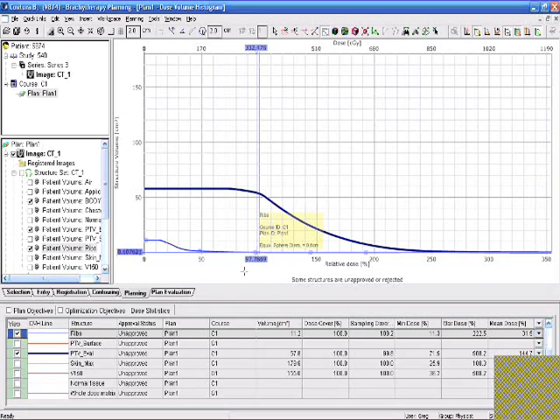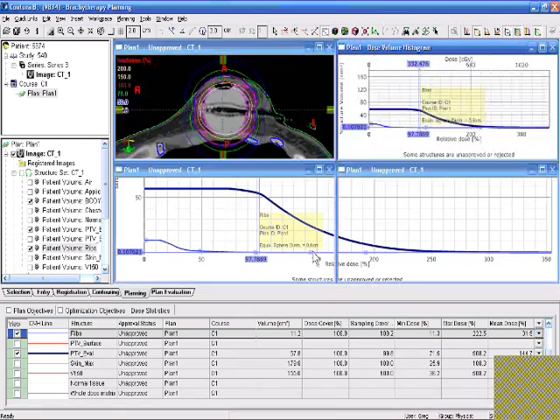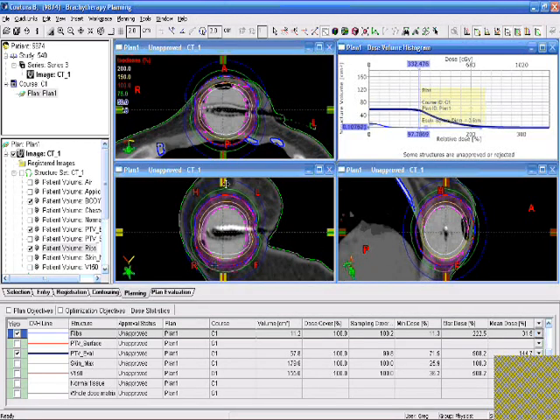here we're only showing 98%. So that's an excellent value, but remember that it's a little bit artificially low. Here's where that percentage is. Whenever we pick out a dose on the DVH here, that isodose will be added to the list here. So it's added here in blue, and you can see where it is. It's right here where it impinges on this rib.